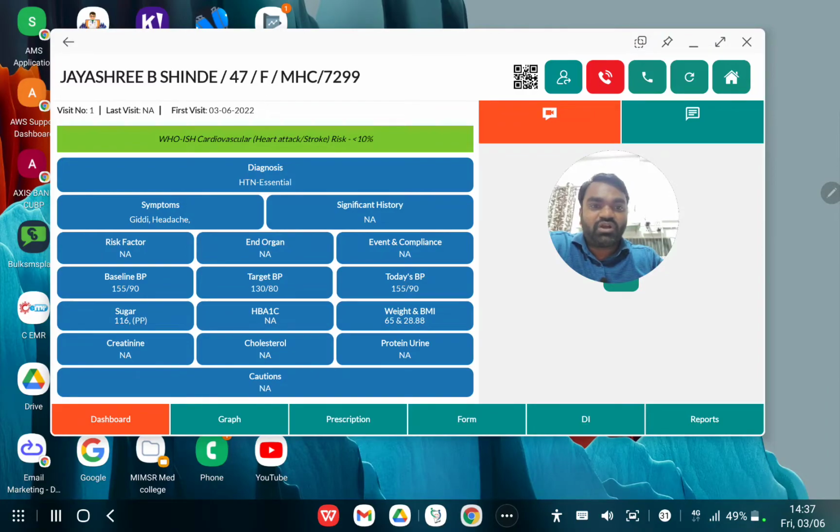We are just going to talk about this patient's ECG particularly. If we see the clinical details, this patient is newly detected hypertensive. She is not already hypertensive, a 47 years female. She had giddiness, she has headache, both the symptoms actually.